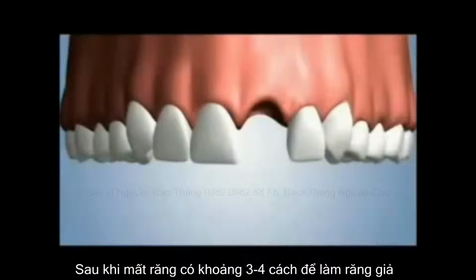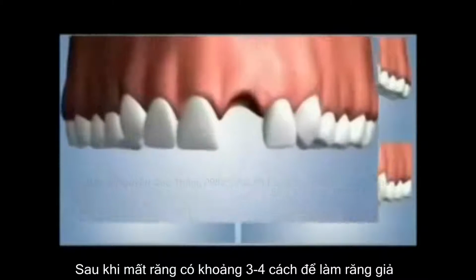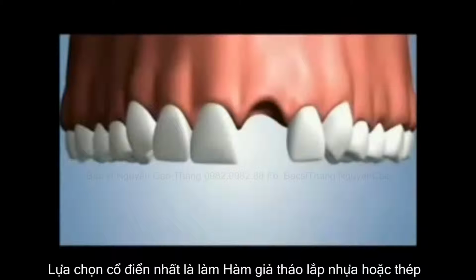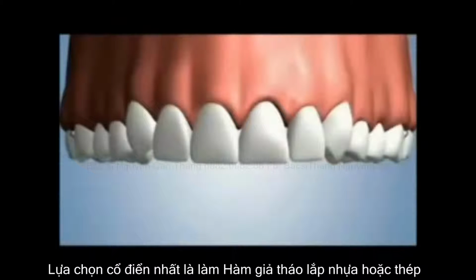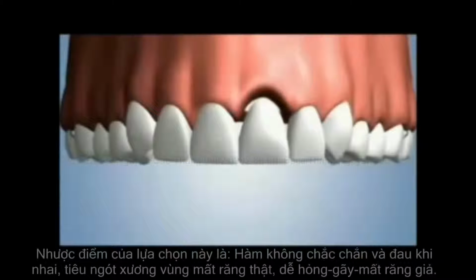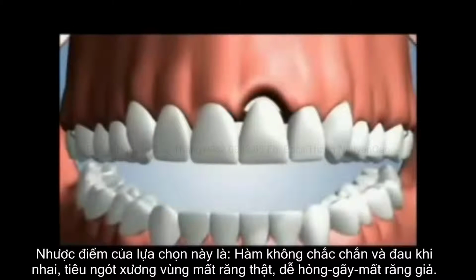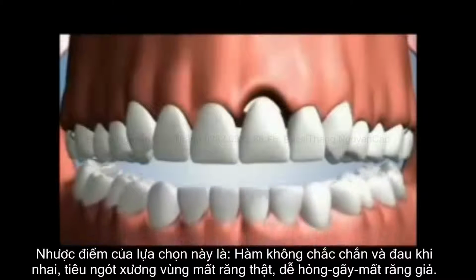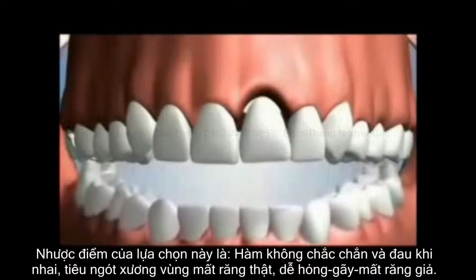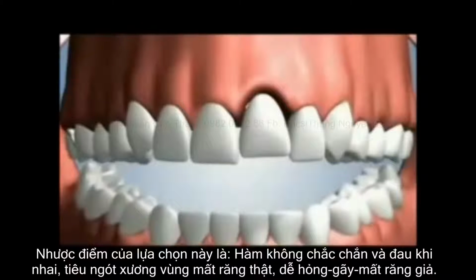If you lose a single tooth, you have various tooth replacement options to consider. One option would be a single-tooth partial denture. A major consequence of this option is the bone loss that occurs due to the absence of the natural tooth root. Biting forces will cause the partial to move and shift because its design lacks a secure connection. Many partial denture wearers may also experience discomfort and gum irritation.